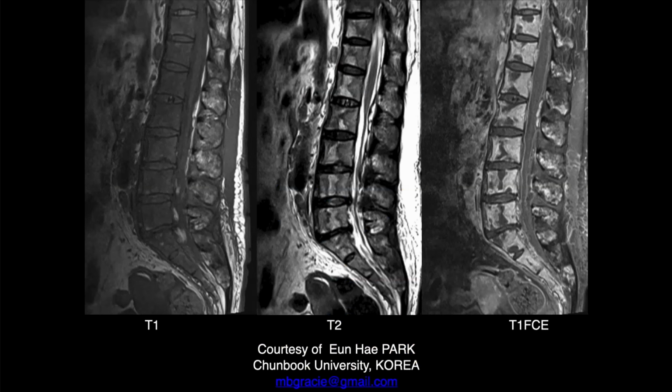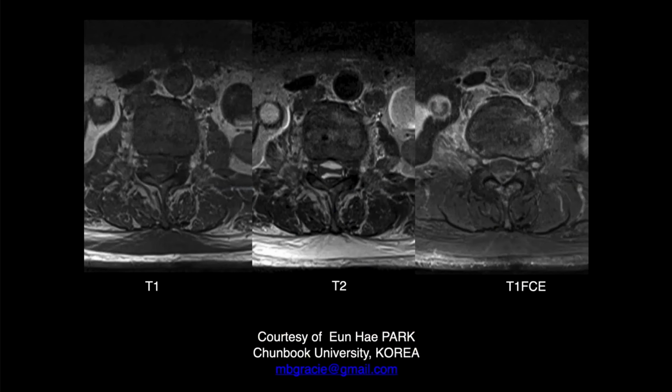Yeah, on T1, just low signal throughout the bones there, the vertebral bodies. On T2, just this irregular signal. Really odd. Post-contrast, is there contrast enhancement? Maybe. Okay, T1, T2, T1 post-contrast, with fat suppression. If there is contrast enhancement, with this history, maybe I'd be worried about metastatic disease.